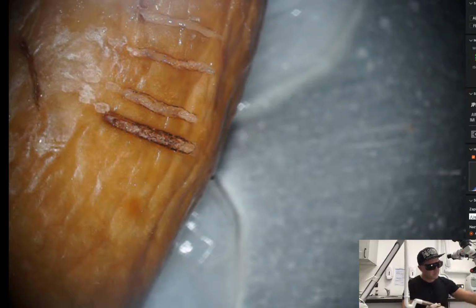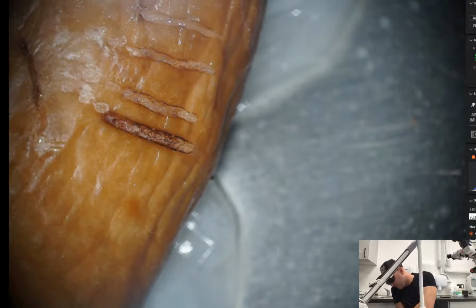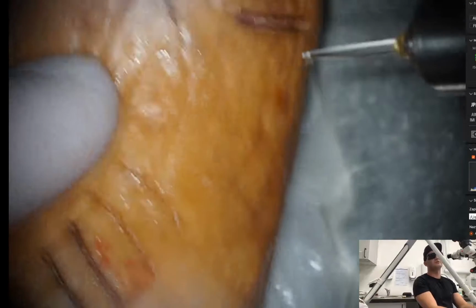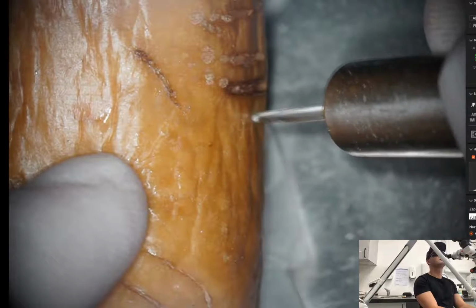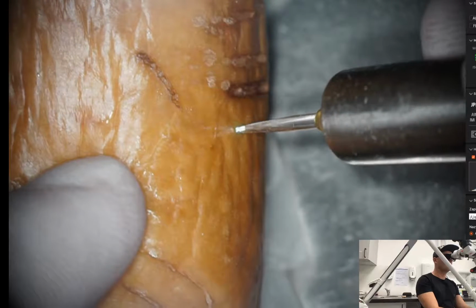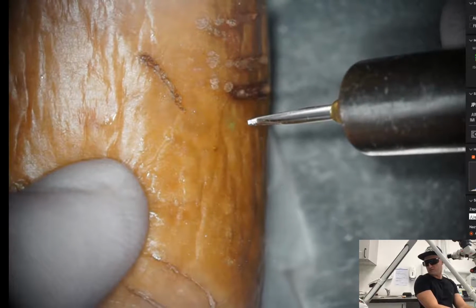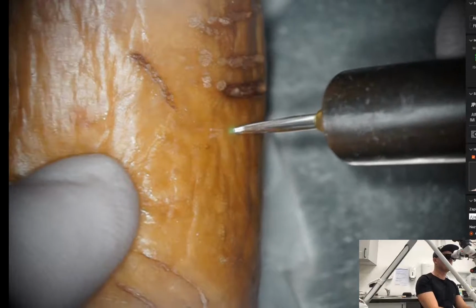Okay, so as you can see, we increase the temperature in the tissues, but when we give additional water, cooling and promoting ablation, and this is the same frequency, 50 Hz and 120 millijoules.